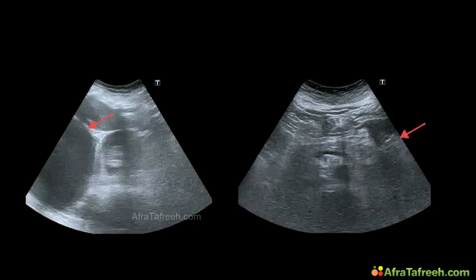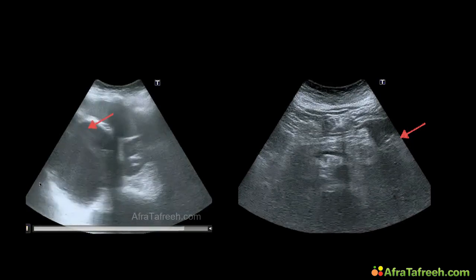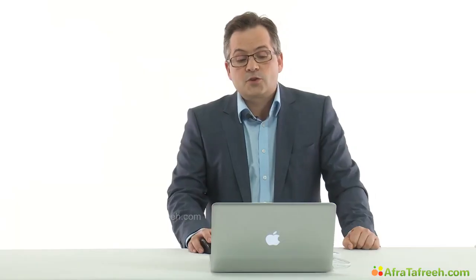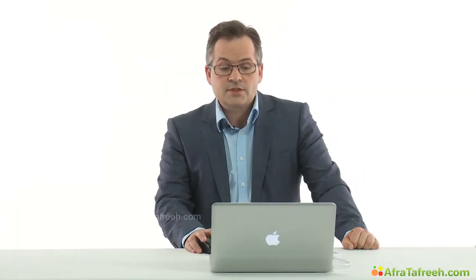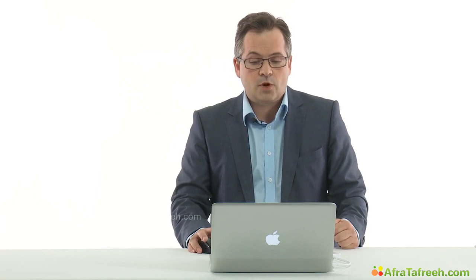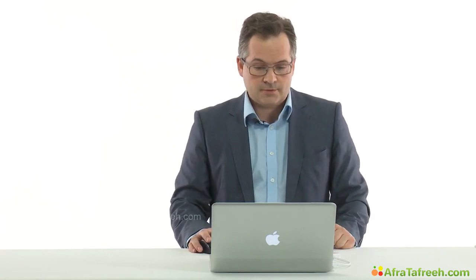You see these huge cysts, more than 15 centimeters in this area. Endoscopy was performed. The cyst was punctured and a stent was placed. So the cyst collapsed in the next 4 weeks and the acute problem had been managed so far. The final diagnosis was a pseudocyst after an acute pancreatitis.